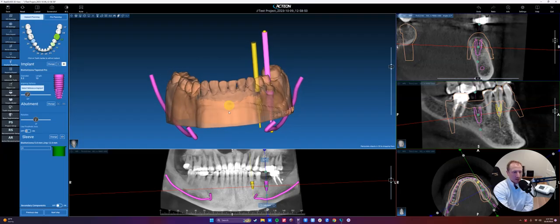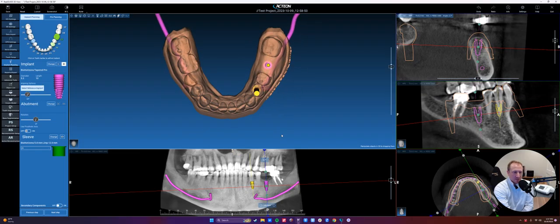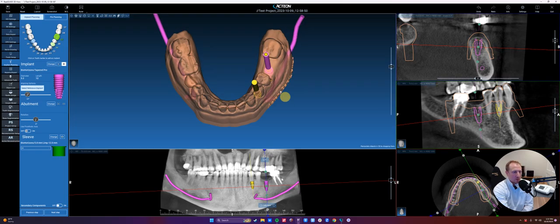Okay, that's it for mostly the simple implant planning stuff. Keep in mind you can change the implant from any of these screens. You can drag, drop, twist, and so on. And your model editing from right-clicking on most things will give you more options.